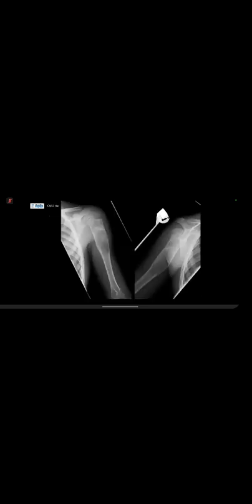Okay, candidate 2. Yeah, so I'm given the frontal and lateral radiograph of the left arm, including the shoulder joint and part of the elbow joint. So I can see a well-defined expansile lytic lesion in the proximal metaphysis of the humerus, which has a few septations within, causing endosteal scalloping, and a wide zone of transition.